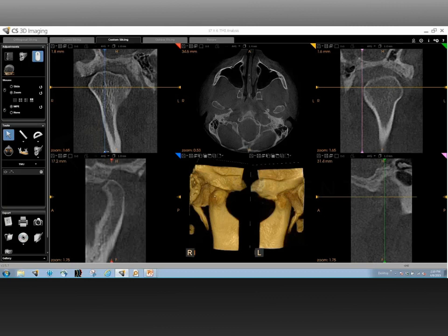Again, we are going further into the condylar head. If you notice, I'm going to stop right there and show you some sort of flattening on the superior head of the condyle, the superior anterior portion of the condyle. Almost looks like the contralateral side. For the sake of consistency, we go back all the way to the medial pole, and let's go ahead and stop there.